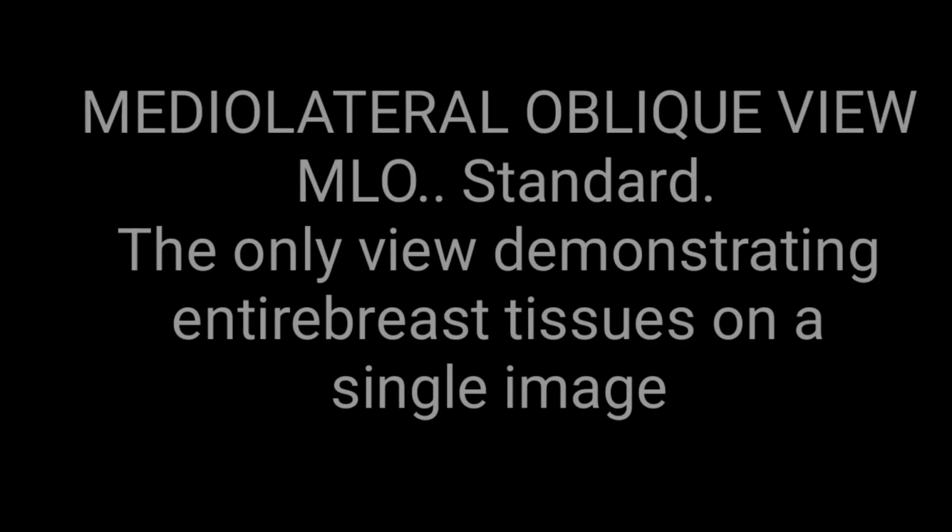A standard mammographic examination comprises imaging of both breasts in two views, namely the mediolateral oblique, or in short MLO, and craniocaudal, in short CC positions. Mediolateral oblique view, or MLO view, is a standard view. It's the only view demonstrating entire breast tissue on a single image.